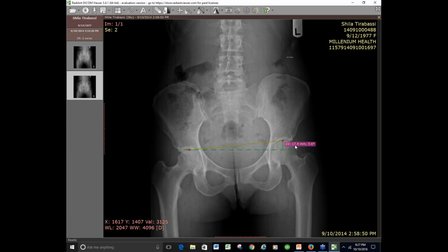17.9 millimeters, and that's about where she is, about 17 is where we've got her. And you'll see if we did that same calculation up here at her hemipelvis, we'll call that 15.5. And we'll call this, just ballparking it. Again, I would be much more accurate normally. I'm just trying to speed things up. So we'll say it's about a 5 millimeter difference. I don't know if anybody's calculated that, but the old way we would have done it is 15.5, 10.5, so she's got a 5 millimeter difference.